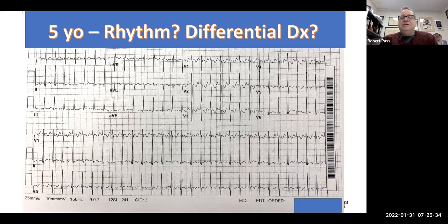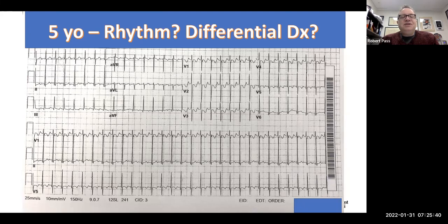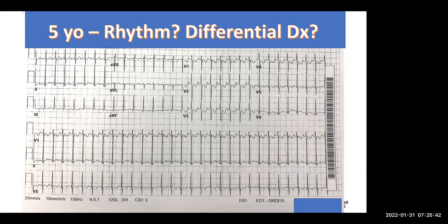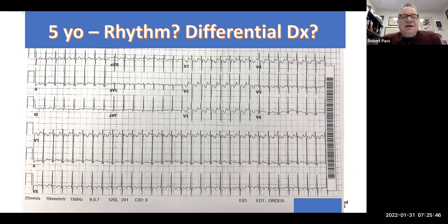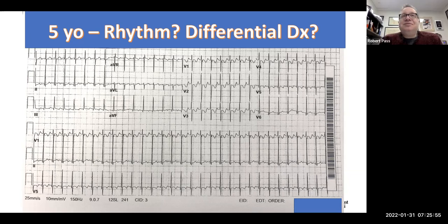No. And you're asking the question, so it's probably not. Well, it's unlikely I'd be showing you a sinus rhythm ECG. Yeah. I have been devious in that manner. I understand, but I think you would agree this is certainly not obviously sinus rhythm, right? I think you can spot sinus rhythm from across the room. This is not sinus rhythm.